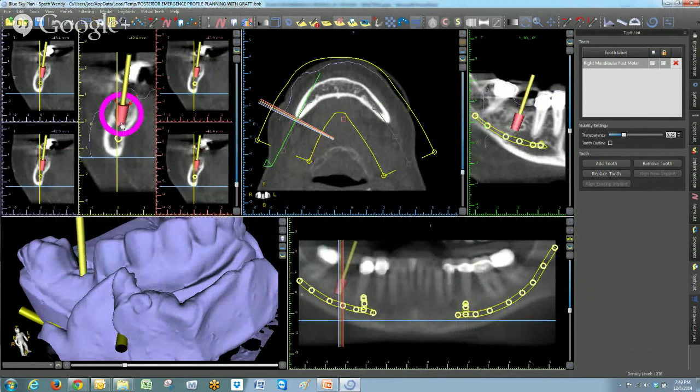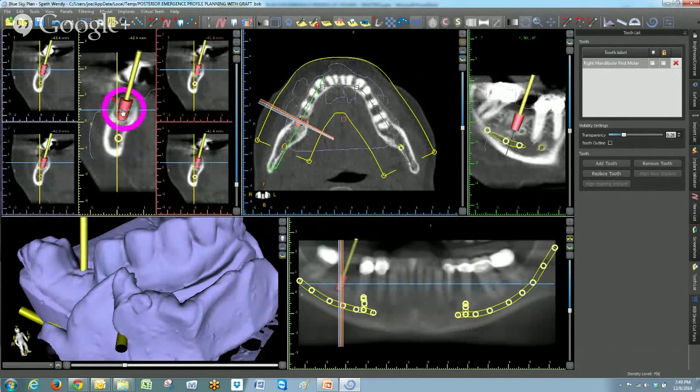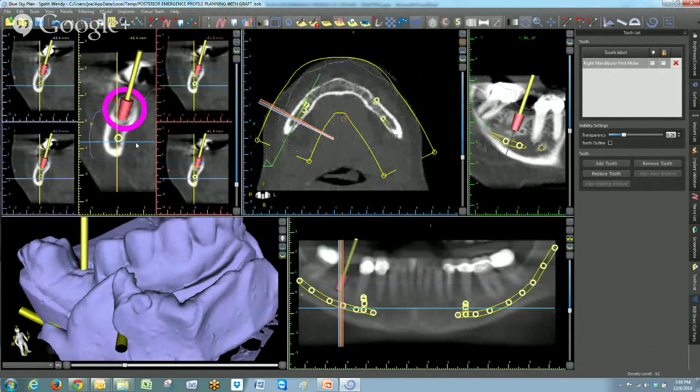Now I'll give you another graphic example here. I'll move the implant up to where we might have it, as you saw in those still pictures that I showed you, and I'll put the tooth in. And what this is going to do is change the dynamics of this case. You would probably have been able to do this case screw retained if you wanted to.